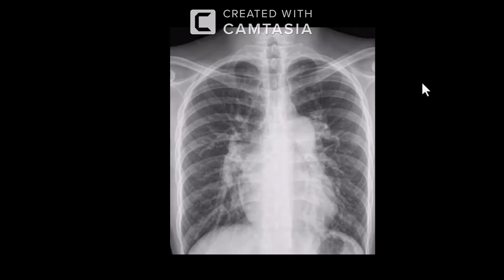I don't see any pleural effusion. I don't see any cardiomegaly. I can see some hyperexpansion in the lung volumes. I am looking at the bones to assess for any bony abnormality. I cannot appreciate any fracture, pneumothorax, or pneumomediastinum. In my routine practice, I would also window it more to see the vertebral bodies better.